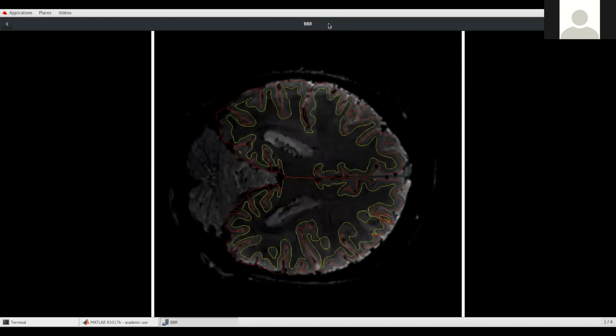If we look at the lines that are placed on the top, essentially we want to optimize so that either side of that line is where the gradient is. With the yellow line, it's quite clear that one side of it is quite dark, while the other side is lighter. There should be some optimal position where that difference over the entire brain is greater in the first step, and then he does it more locally.